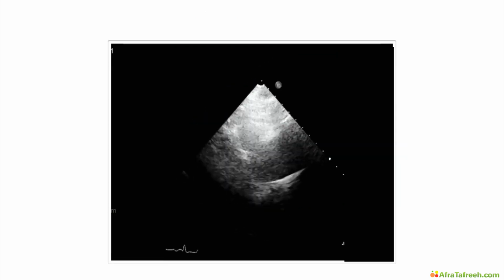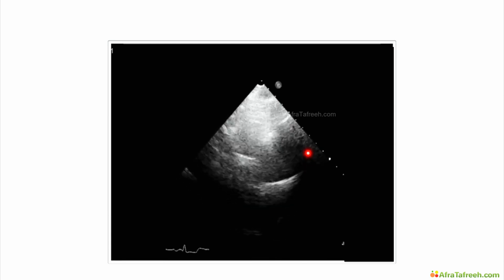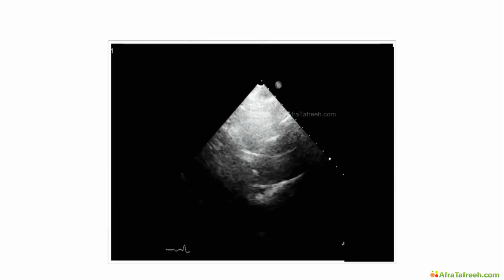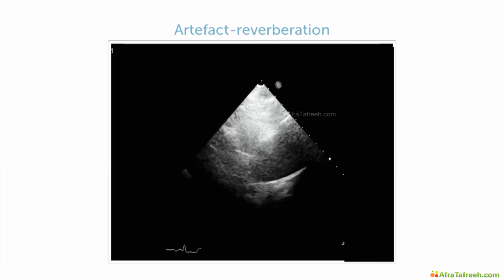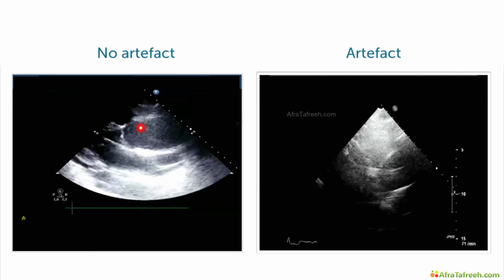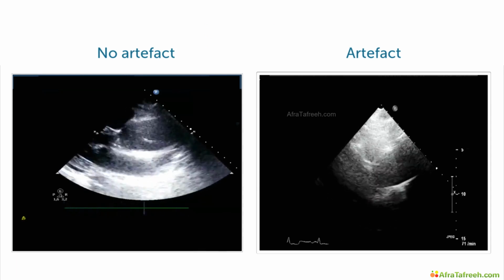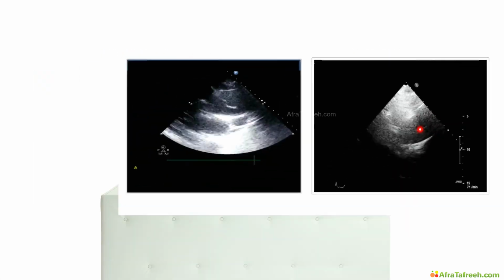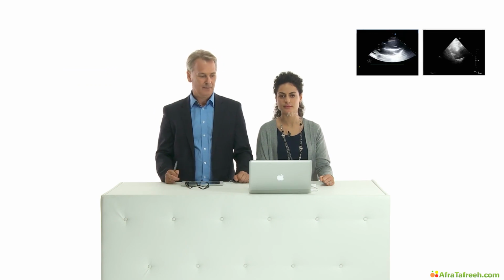And what about this patient here? Well, do you think this is dissection? It would appear so because it looks like there's a membrane here, but in essence, this is one of the biggest pitfalls in echocardiography. This is not a dissection. This is just a reverberation artifact from the front of the aortic wall. And for comparison purposes, look at the motion of this dissection membrane here, which moves kind of awkwardly and desynchronous to the anterior wall. This is not the case here. So you could easily mistake a patient for having a dissection if you don't look into this finding.